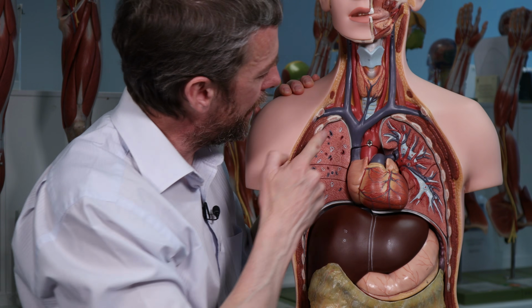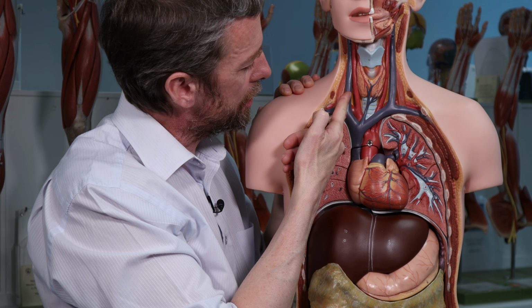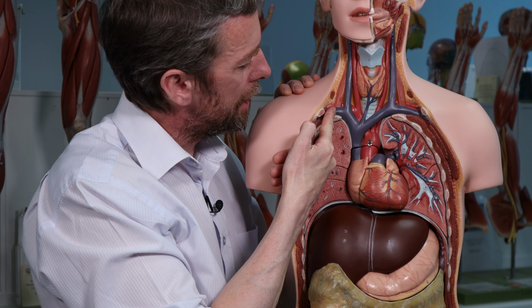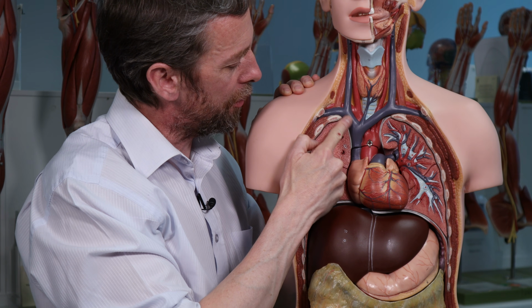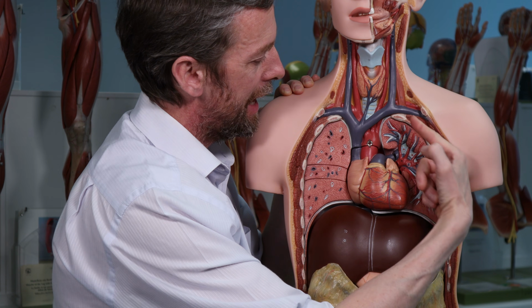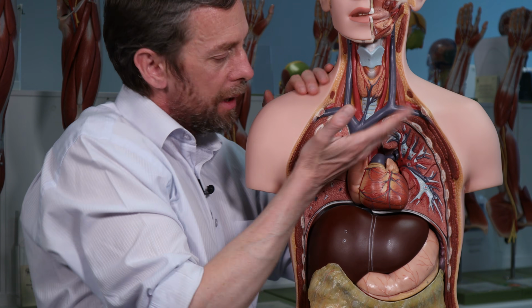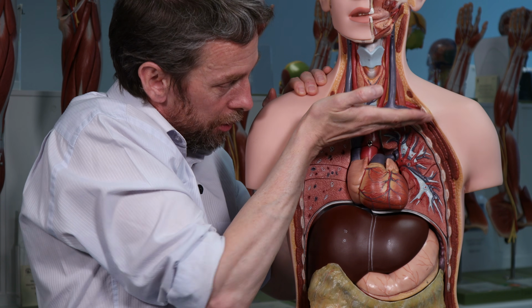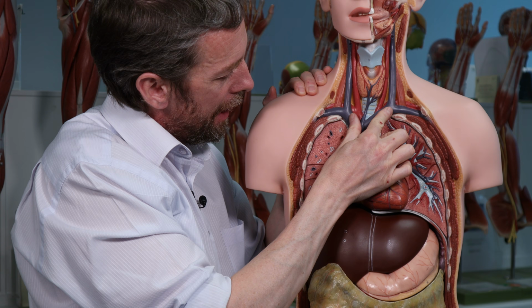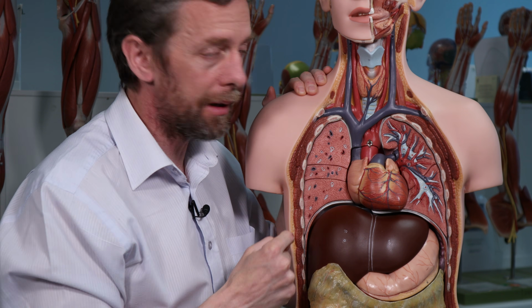As I said, the veins are superficial to the arteries. There's the internal jugular vein and subclavian vein on the right side, coming together to form the right brachiocephalic vein. Here it is on the left side. Look, it's got to go across quite a bit further. So because of its shallower angle, it looks a different shape when you cut a section through there. They come together and form the superior vena cava here.